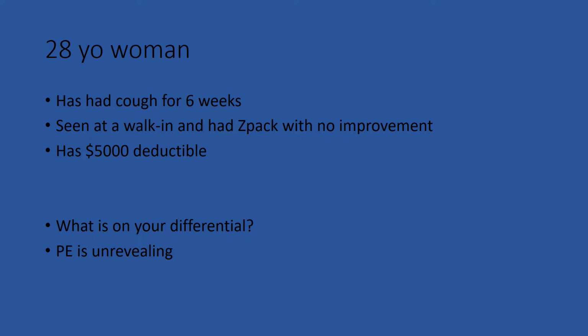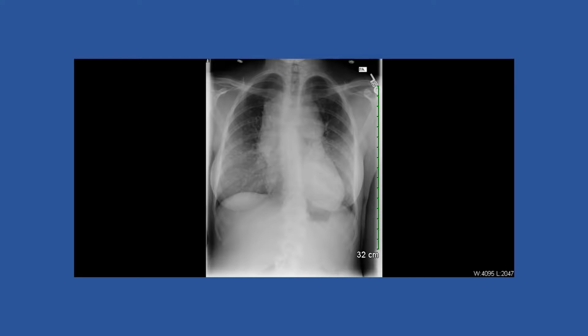When you examine this patient, there's really not anything to hang your hat on. There's not a lot to figure out. In this particular case, the clinician seeing the patient talked it over with the patient and decided that the idea of a chest x-ray was probably useful. The chest x-ray actually does show some pretty dramatic abnormalities.